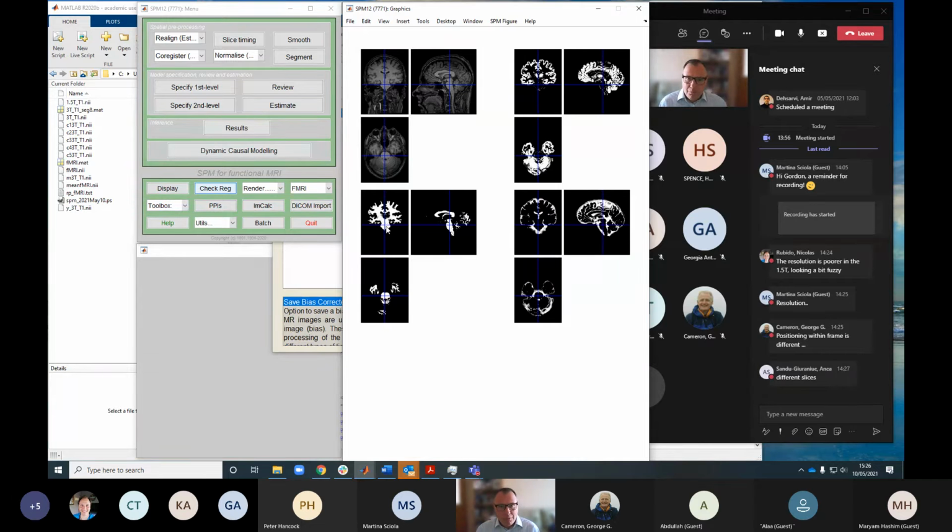So that has a very high probability of being white matter, which is good because that's the brain stem. If you look in the grey matter image, we can see that it's black, has a very low probability of being grey matter, which is also good. And then if we look in the CSF image, we will see that, again, it's black because it's not CSF.